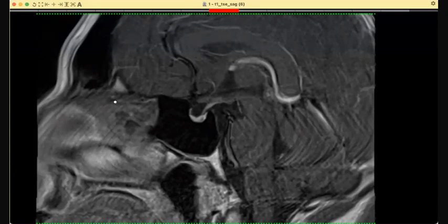Can you explain the symptoms with this finding? No, I would not be able to do that with an anterior pituitary mass lesion. So there is also enhancement of the pituitary stalk. Anything else you would like to see?